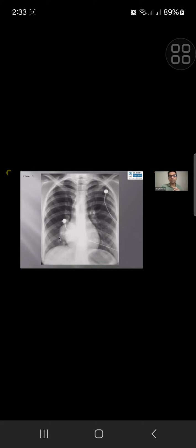But this nodule or mass, it's outlined by air mostly. Except the innermost border, you can see most of it is outlined by air, which means that it's in the lungs, isn't it? Do you get the perspective? So there is no need to bring out the mediastinum here. You can say that it is projecting over the mediastinum, but I can see the inner border through it. So it's probably in the lung in front or behind the mediastinum. Does that make sense? Yes, that makes sense.